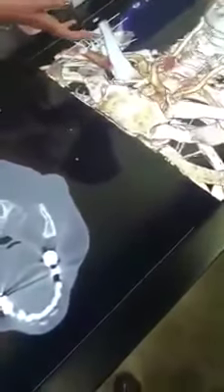So here we have a post-operative scan of a patient with a brain aneurysm, and this is the actual CT that was provided. You can go ahead and slide through the CT and see exactly where the clips were placed as well. So if I go down here, it'll show where it is. And same functionality as before. You can go ahead and make a quick cut into the 3D model and see where the clips were placed as well. So it's kind of more intuitive when you see something in 3D, where the clips were placed rather than just focusing on a CT.